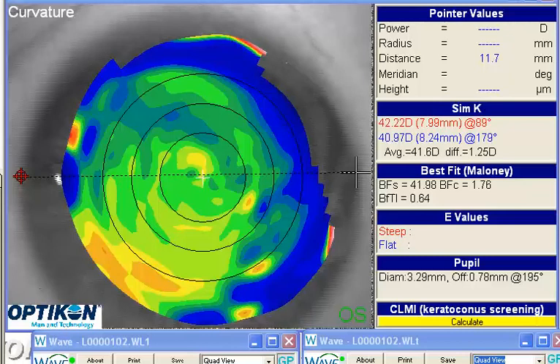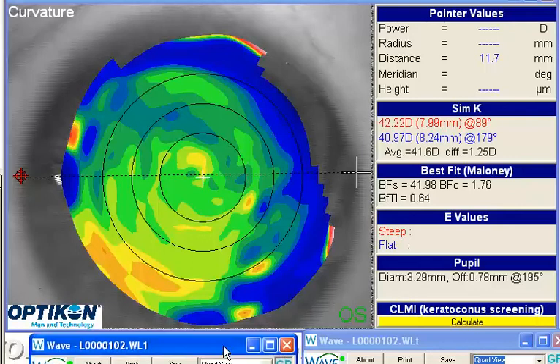I see from your case that you have a patient that you're trying to fit with a wave lens, and you're having trouble with this lens dropping, decentering. As you know, that's partially probably from the weight of this lens with that prescription, but if we look at your topography, there's a couple things that may help you out here.